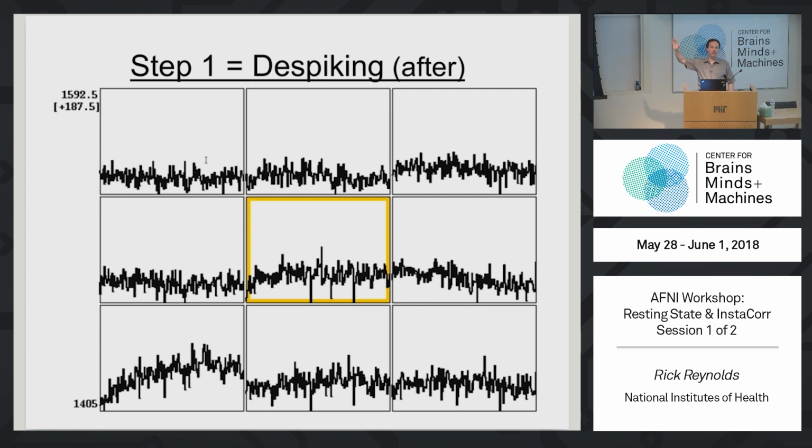So remember, like with outlier counts, we get a median absolute deviation from the trend. So at each time point, you know how many of these MADs you are from the trend. And the despiking operation, basically, if you're more than 2 MADs from the trend, it maps 2 to infinity down to 2 to 4.